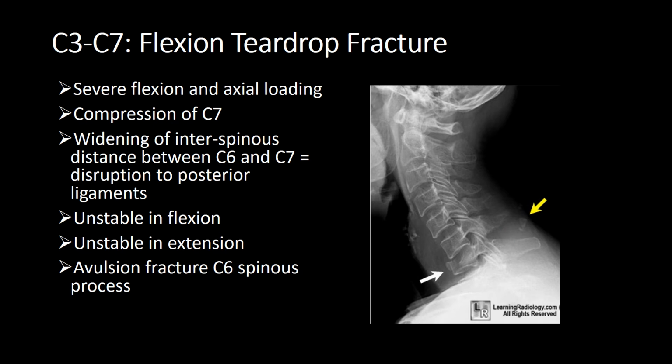Okay, B is for bones. Nothing going on there, nothing going on in the mandible. There's our anterior tubercle of C1. Let's look at C2, go around the cortex of C3, C4, C5, C6. And here we have a wedge compression of C7 with loss of the anterior vertebral height. We've got a little step in the cortex there, marked depression to the superior vertebral endplate. We have a compression fracture of C7.